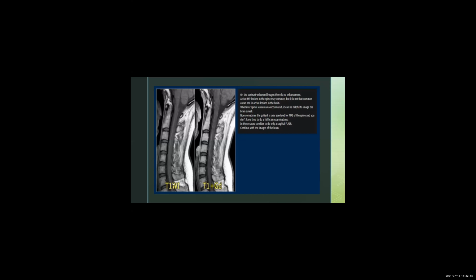So this is T1. Now sometimes, for some cases, we'd like to give something called contrast. Contrast is something that they inject into a patient after they get a scan done, and that really helps us, the radiologists, in terms of seeing if there are masses, or if there is infection. Essentially, it lights up a lot of structures for picking up other additional findings.